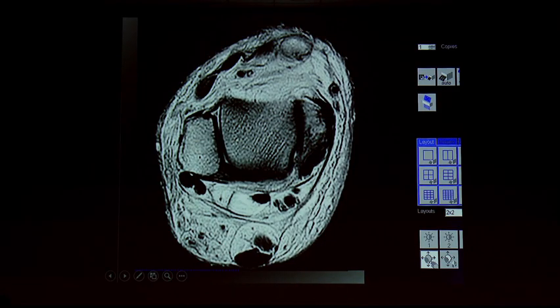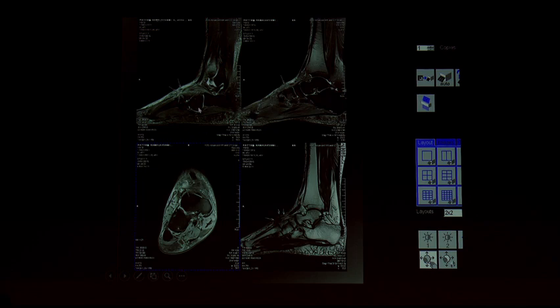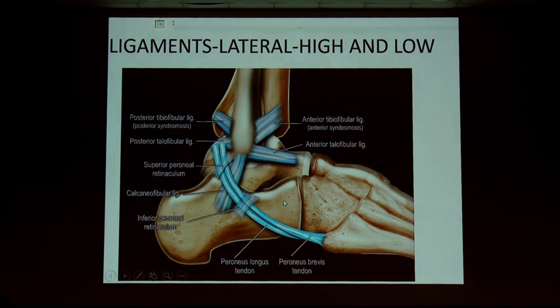Abnormal, you can see the tendon. This is tibialis anterior has gone for tear with intrasubstance bright signals, and you can see the EDL. You can see the EHL has gone for tear, and you can see the sagittal image beautifully demonstrating the EHL has gone for tear and intrasubstance bright signals. It is the EDL. You can see the EDL has gone for tear with intrasubstance bright signals.